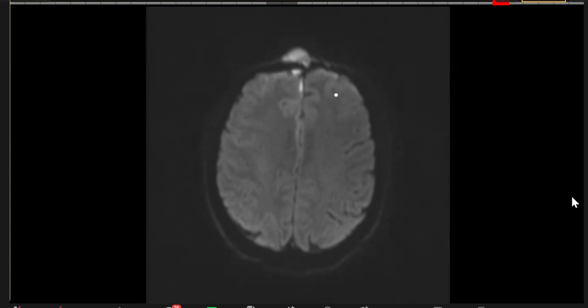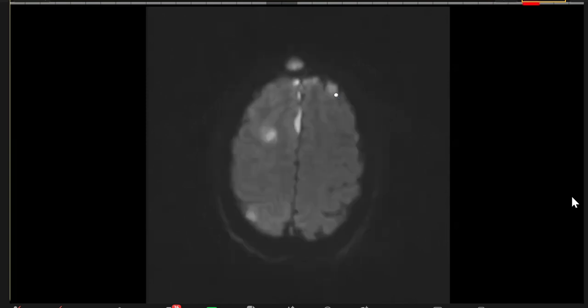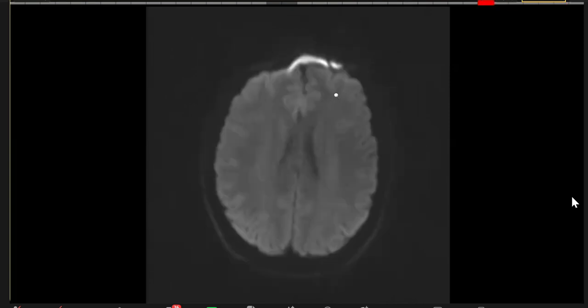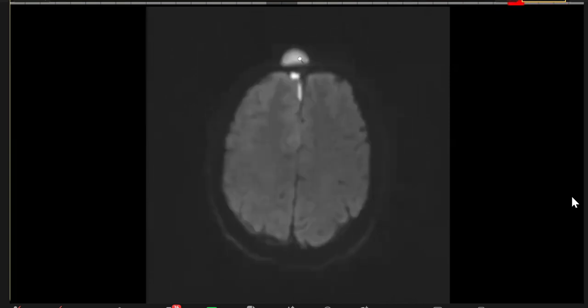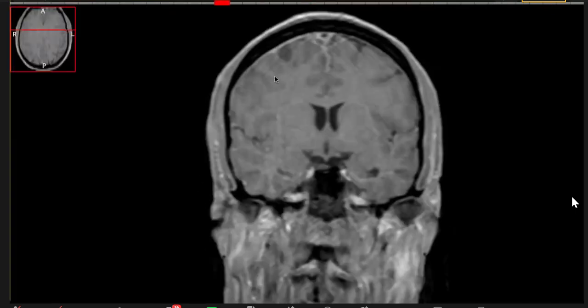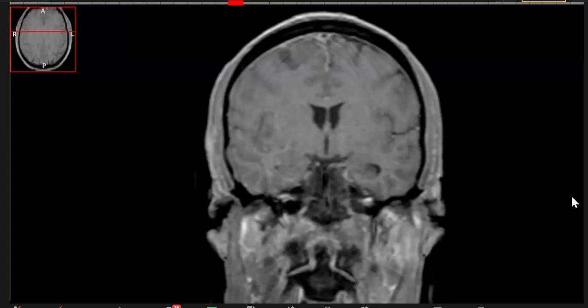And it was an adult. I think this was a 40-year-old. Usually it's children, and then these subtle findings where everything is checked. So this is the kind of case. This is a classical 2B case, which it was. This patient had a burr hole done. They did the burr hole from here, and we have many post-op scans for this patient.